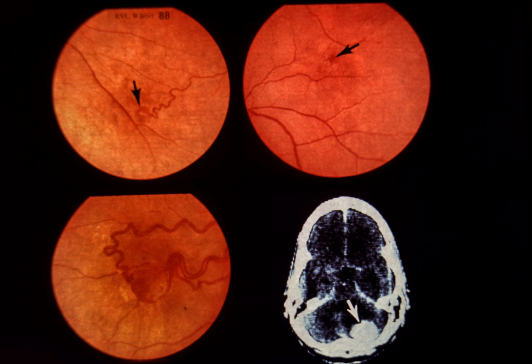At craniotomy, this proved to be a solid hemangioblastoma. This patient has the syndrome of retinal and cerebellar angiomatosis, or von Hippel-Lindau disease. The retinal lesions begin as small endothelial cell rests and may appear at any age, usually during childhood or adolescence. The lesions may occur anywhere in the fundus and may involve the optic nerve.